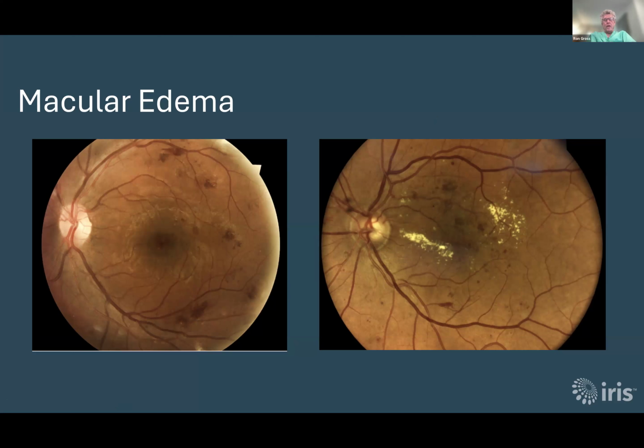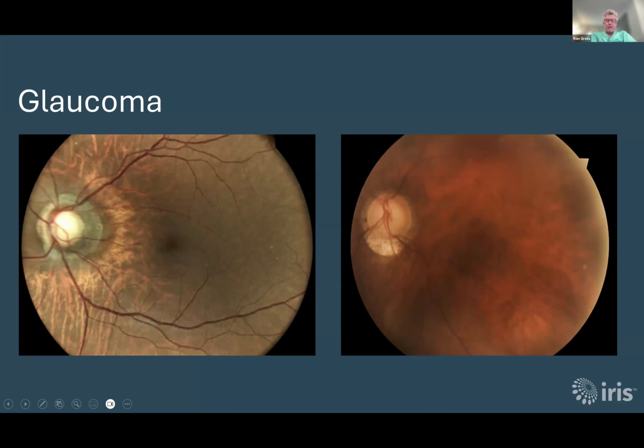What happens in glaucoma is that those living wires that are going from the retina back to the brain get damaged. And here you can see glaucoma on the left particularly shows it well, whereas in the other one you had a small little white disc in the middle and a fair amount of pink. Here you've got a big white disc with almost no pink remaining. And that's what happens in glaucoma. Glaucoma typically affects the peripheral vision, not the central vision. Most of these people, until very late in the disease, are asymptomatic because it progresses very slowly.